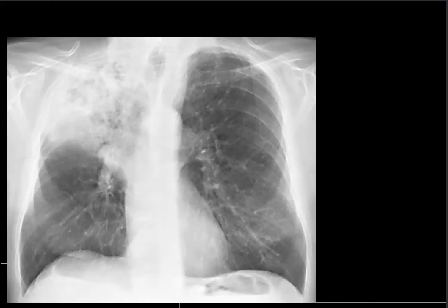So this is consolidation, and it is centered over the upper third of the right lung, and you can't really see the superior mediastinum anymore because that diseased lung is sitting right up against it, and the x-rays see them both as the same density and therefore will not make the differentiation as clear as it should be.